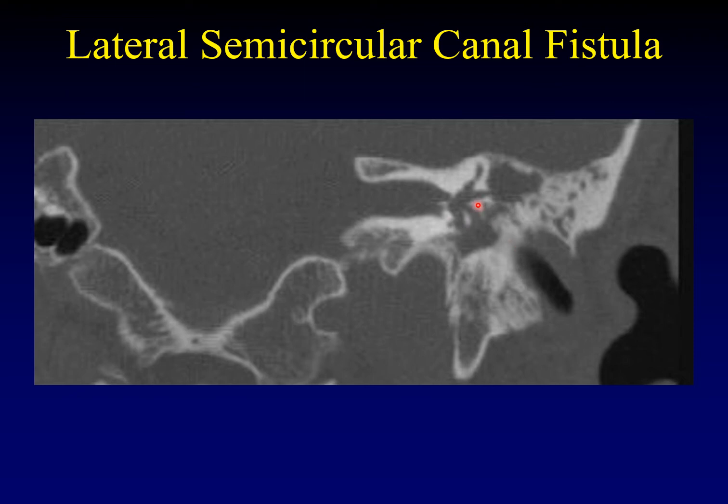So here is the lateral semicircular canal, and the bony covering of the lateral semicircular canal is eroded. There is a fistula between this lateral semicircular canal and potentially the middle ear cavity.